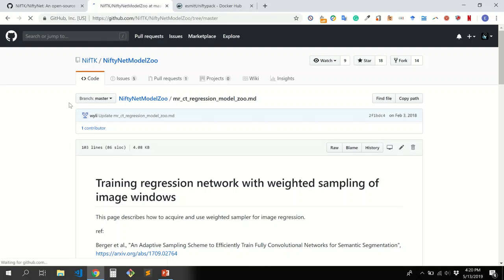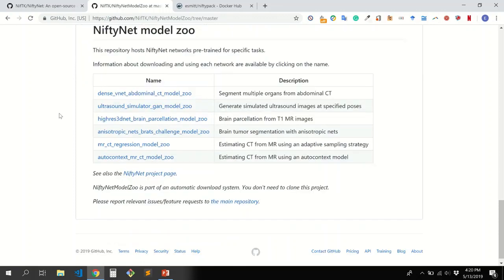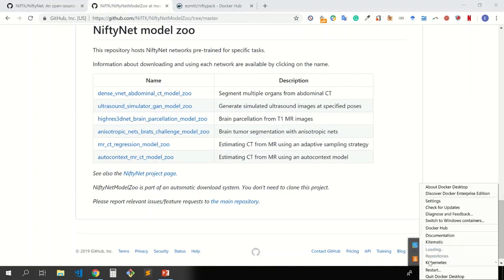As I mentioned, there are several, well, not several, the most famous models like VNet, GAN. Where is the UNet here? I think the UNet is, I don't remember which one on this one. Okay, when you're starting this, it requires the login and password that you create to download this. Okay, it's running. That's perfect.